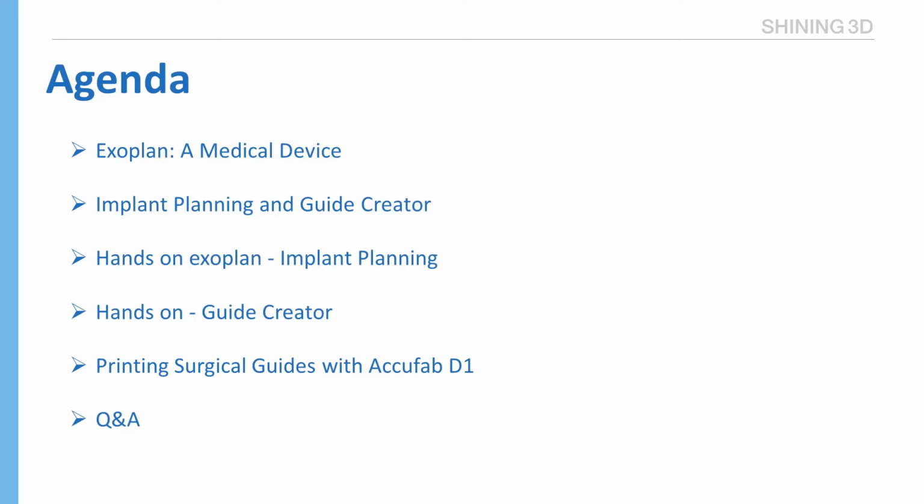After that, we will finally step into the practical demonstration of the software, editing an implant planning and the design of the surgical guide. And then we will export our file into our DLP printer software for the final production of the surgical guide itself. As always, at the end of the demonstration, we will have a Q&A session and we will be fully available to answer your questions.